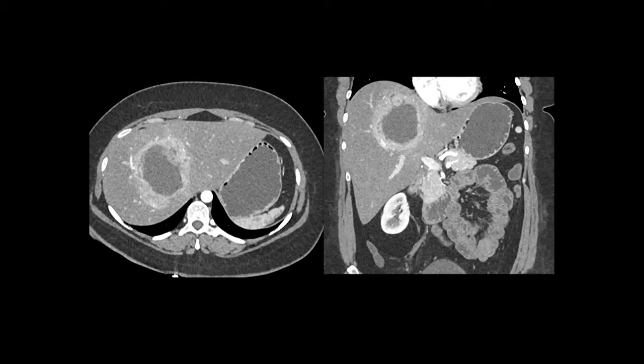Could this be a primary neuroendocrine tumor? Most of the time we see metastasis, but in fact, it is a possibility. Neuroendocrine tumors can be very vascular with central necrosis. What this is not, however, is a hemangioma. Yes, the lesion has peripheral enhancement, but with hemangiomas and arterial phase imaging, there's peripheral puddling. When you see the entire rim enhancing and the rim is over a centimeter in thickness and it's homogeneous, that is not a hemangioma.